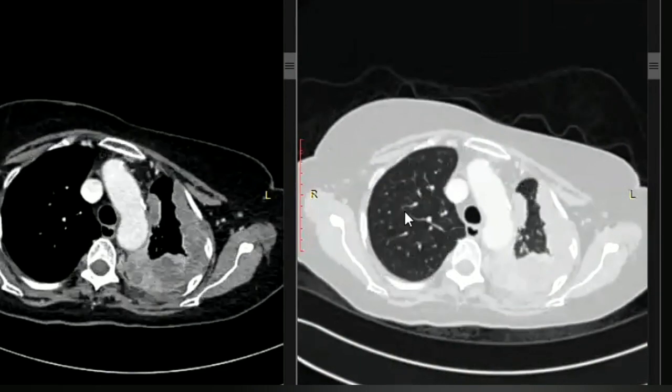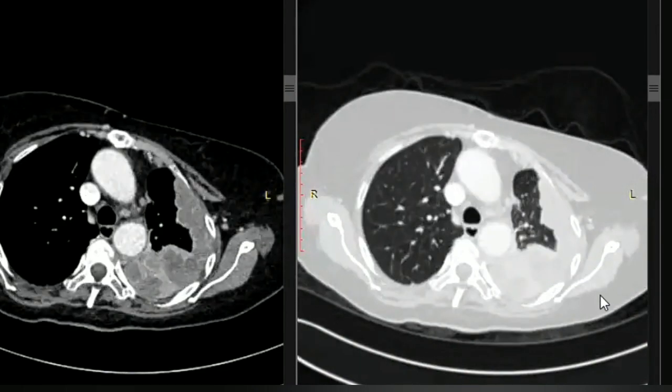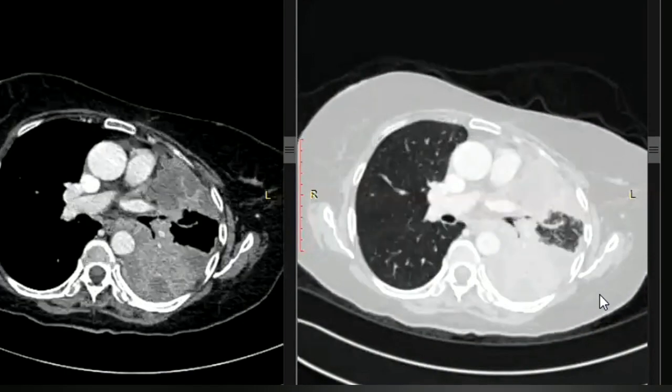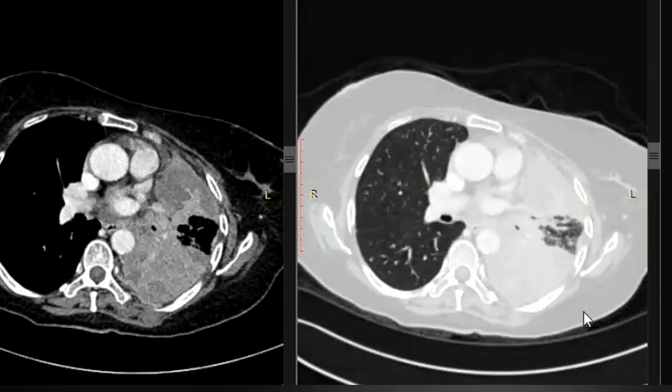Okay, have you seen the lung windows? No, ma'am. Can you please review the lung window? Yes, ma'am.